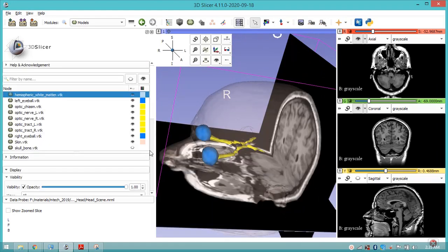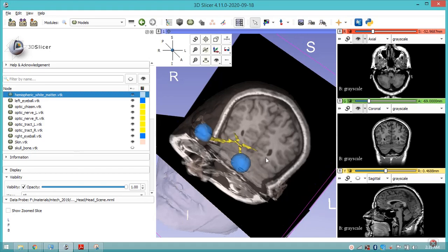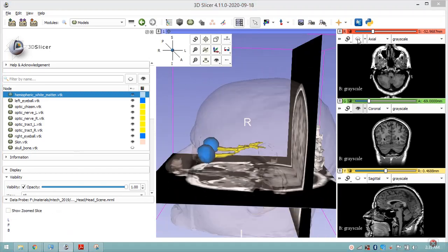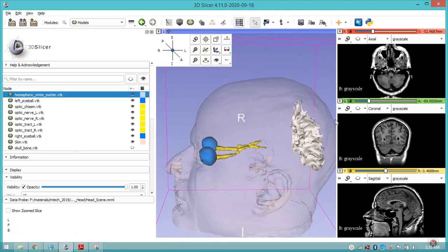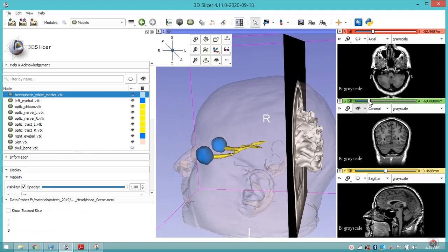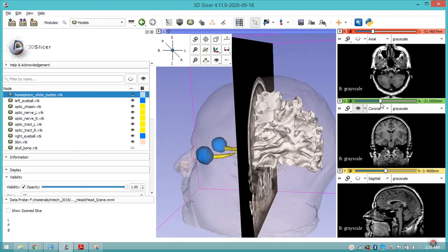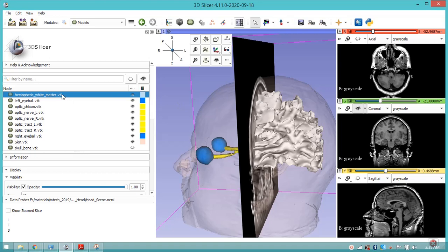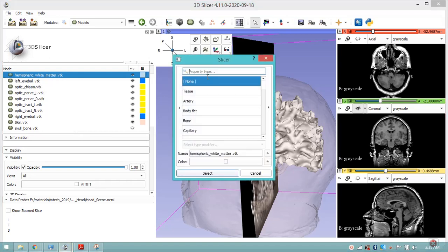I demonstrated isolation or display of only optic chiasm. We can also isolate or display models of other parts by clipping other parts like white matter, skull, eyeballs, etc. We can also change the color of different components in the models. We can rotate the model or spin it interactively with a human icon indicating the orientation of the model below. In other words, we can view models of different parts interactively in 3D Slicer. It is user-friendly.